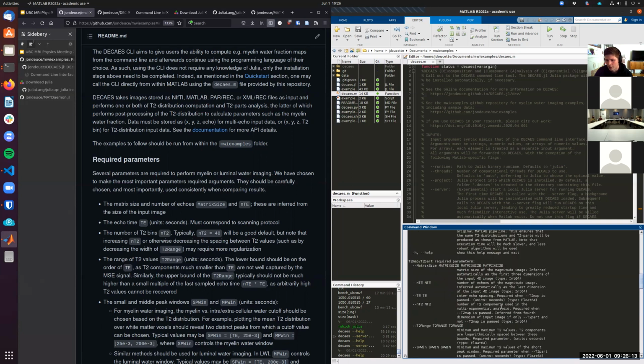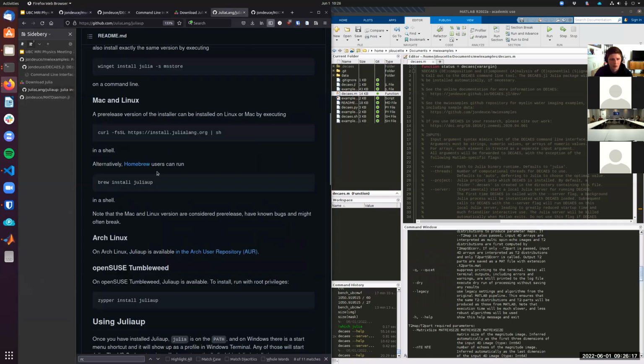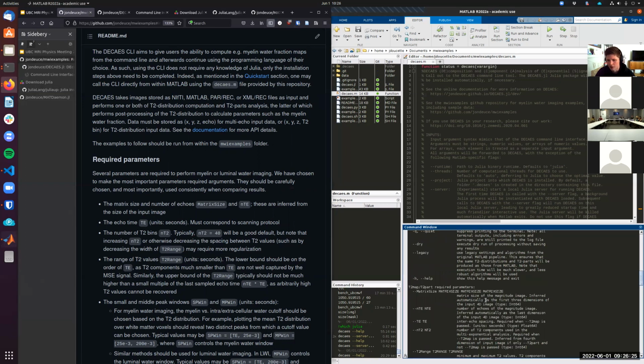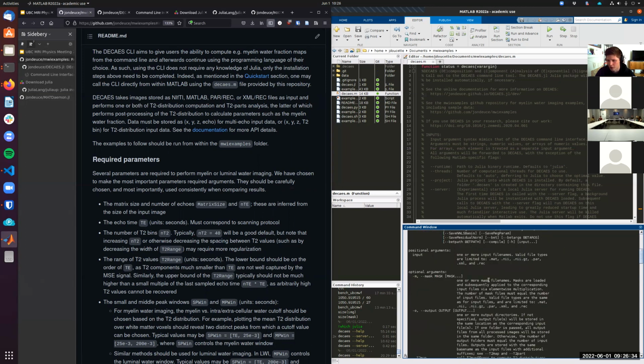Well, thank you. So yeah, you'll have to install Julia, probably through Julia Up, the package that I was recommending before, which is the easiest way. And then after you install Julia, decaes will be installed itself when you run it from MATLAB. So that's actually what happened here. When I ran decaes help, it started installing decaes for you, but it did require that there's a Julia installation available.